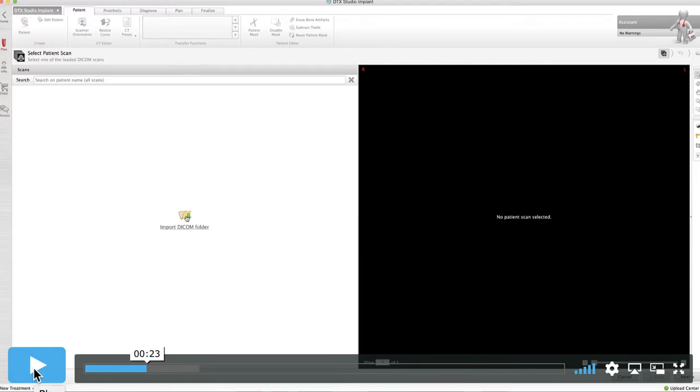And we can set it up to where I believe the raw data, or it should be, is saved somewhere on your network server. If not, then we can work with your IT person on that. But we can set it up to where when we look to import it, it's going to look to the folder where that information is being saved to.